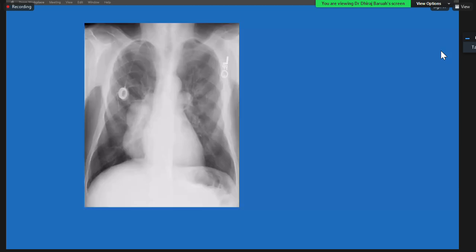Okay. So coming to this lesion, quite similar to the first lesion you saw on the right side. So it's a mediastinal lesion extending mainly towards the right side. You see the cardiac border here. So it is not in the anterior mediastinum. Otherwise, that would have been obliterated. We call it the silhouette sign, whatever you call it. The main idea is to localize where the abnormality is. And then you see the pulmonary artery. So it should not be in the middle mediastinum.